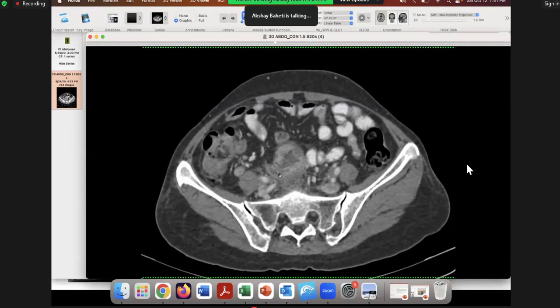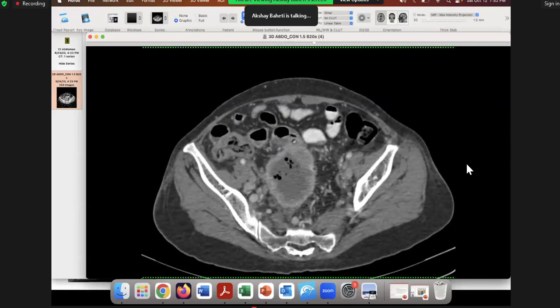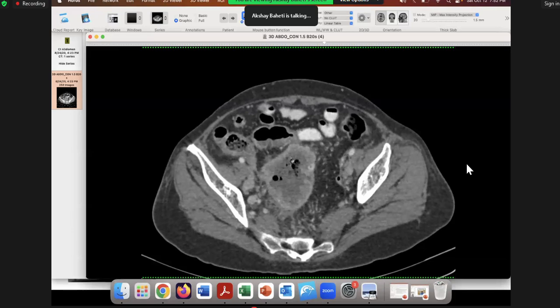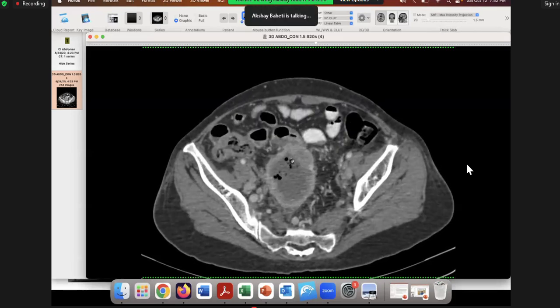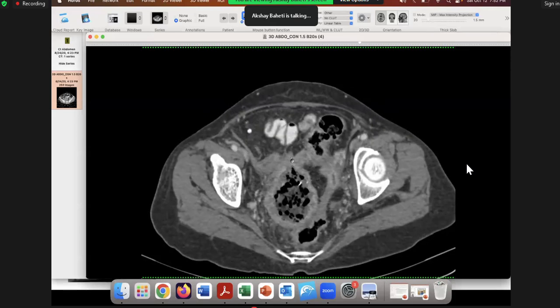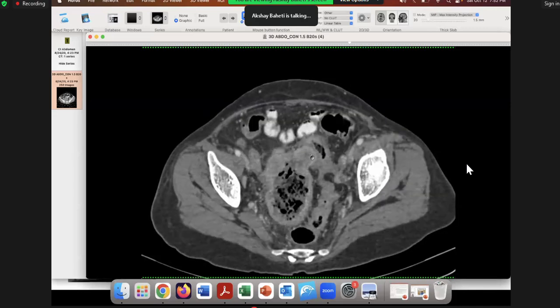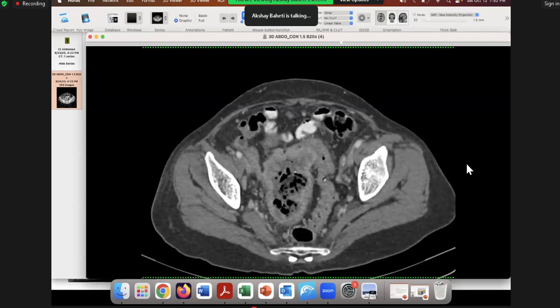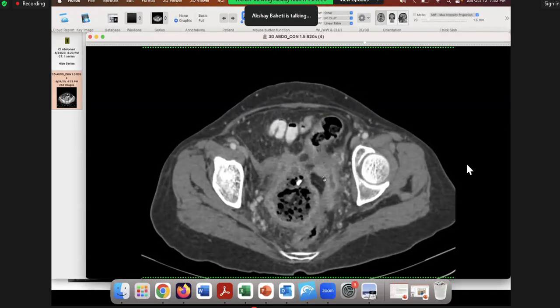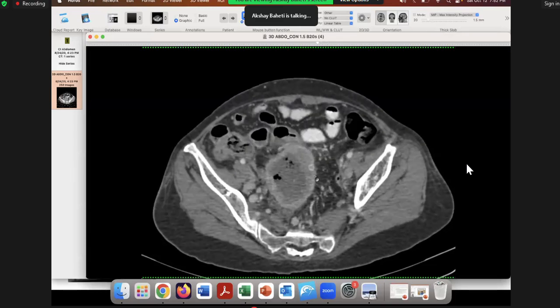But is the bowel dilated or what? All of this is not looking like bowel to me. I don't see any bowel wall here. So I see it's something exophytic, or something like that. So aneurysmal dilatation of lymphoma is a good thought. Generally, they are more homogeneously enhancing, and generally you can make out that there is circumferential bowel wall around it. Not always, but generally. Okay. So I would keep that lower down in the differentials. So what else?